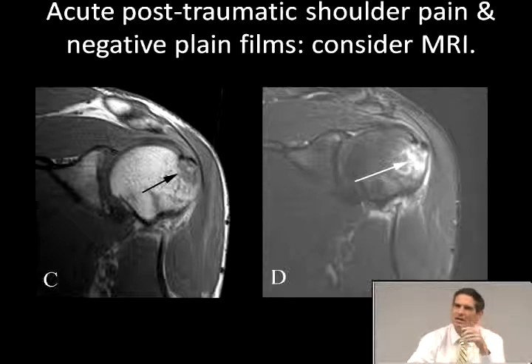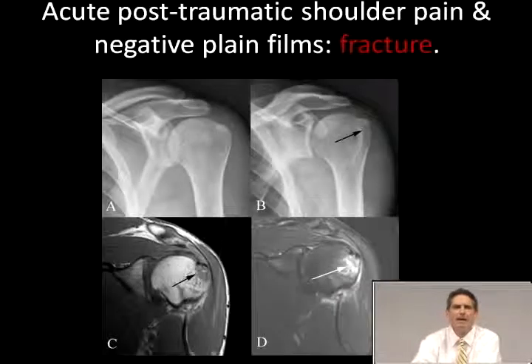So this is certainly a contusion, and you can look at the line on there and say, well, this is actually at least a trabecular fracture. It probably extends to the cortex. So this is kind of a straightforward fracture, which is hard to see on the plain films.